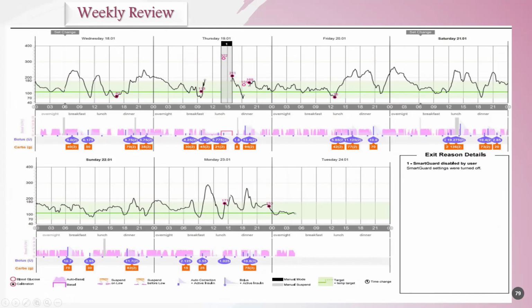And sometimes when you see the weekly reviews, like the one we see in the CGM, we will see the pattern maybe Friday while he sleeps, when he woke up by 12, the reading is shooting high. And Friday nights, with next Saturday, although he didn't eat, the blood sugar is going high. So most of the time he did not announce a meal. Okay, so weekend patterns can be seen in the weekly review, and then later you will go and see.